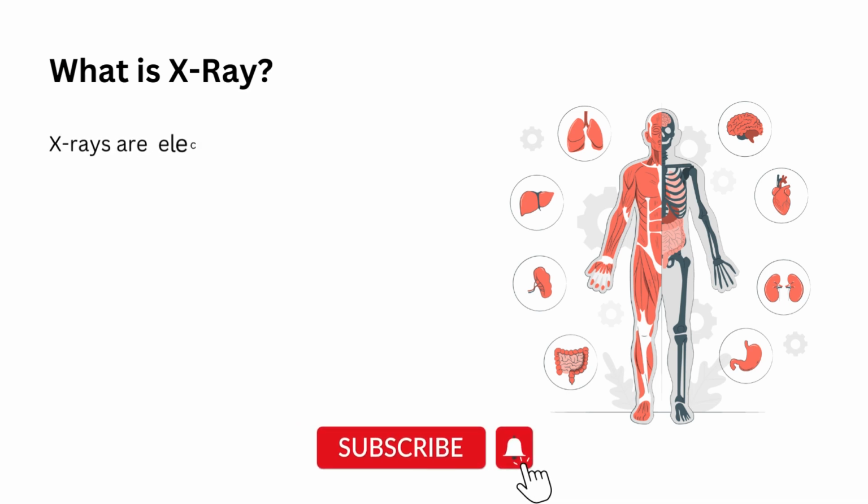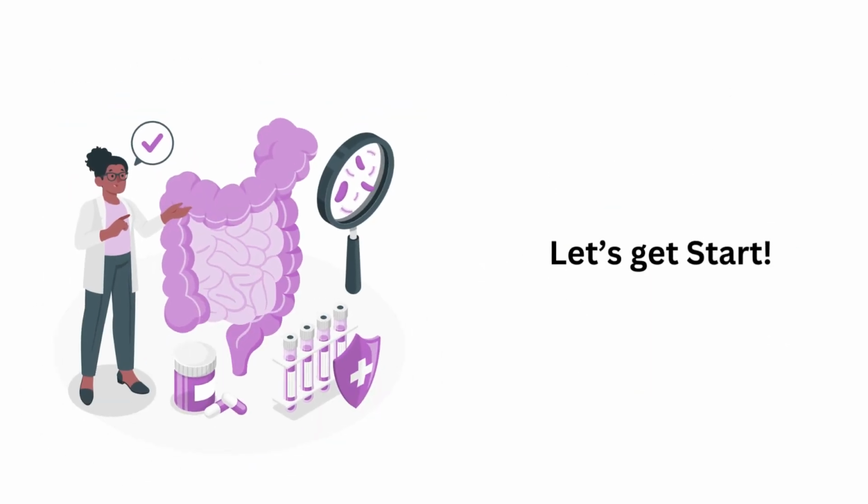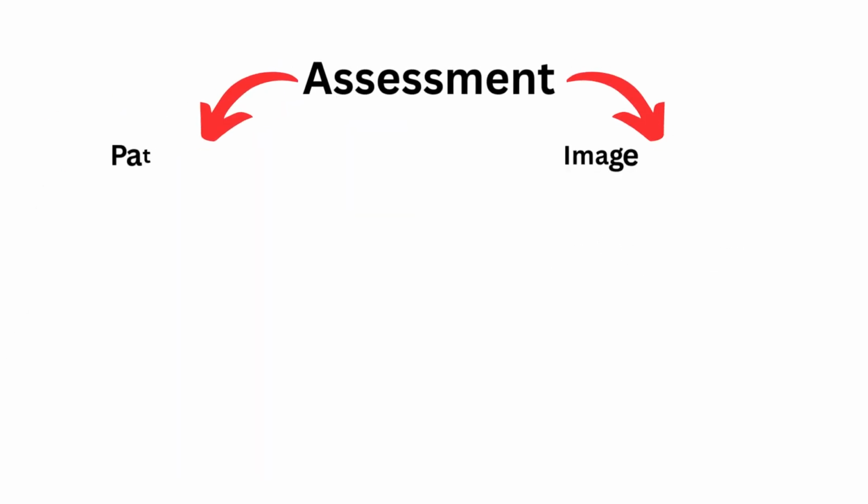X-rays can be considered as the photographs of the inner body parts. Whether you are a seasoned doctor or a medical student, understanding an X-ray is crucial for your day-to-day practice. So let's get started. In the assessment, we need to check the patient details and image quality.